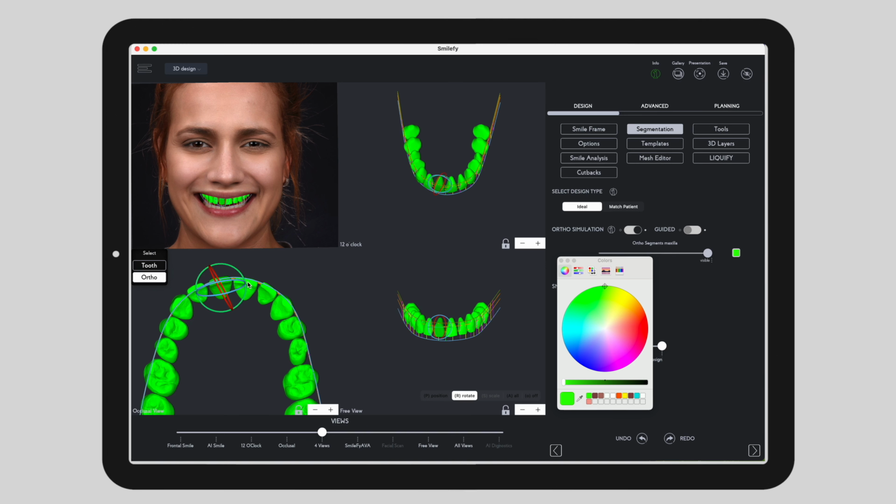Align the teeth on the occlusal curve. Start by aligning each tooth to the selected occlusal curve, symmetric or patient-specific. Select a tooth. Move it along the curve until it fits the planned arch form. Repeat for all teeth in both arches when required. This step helps establish proper arch alignment, a symmetrical foundation for aesthetic design.